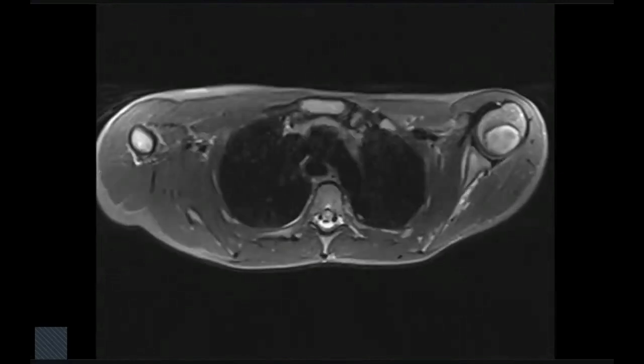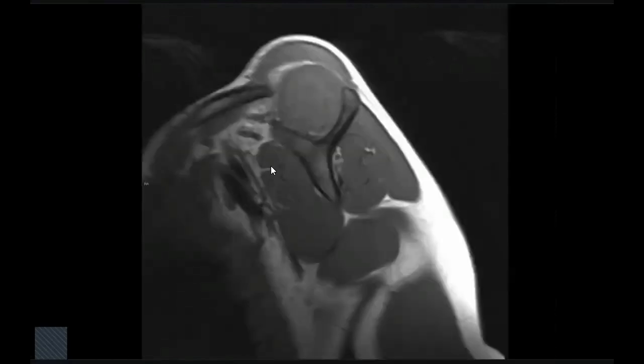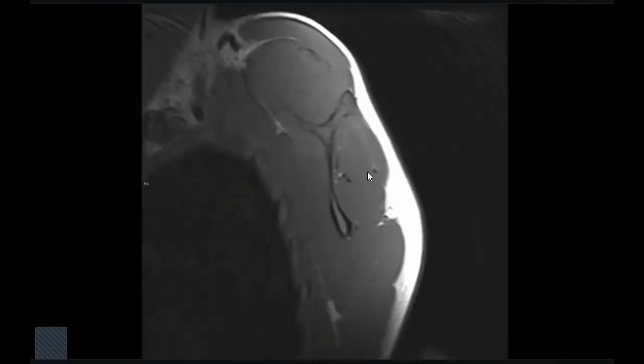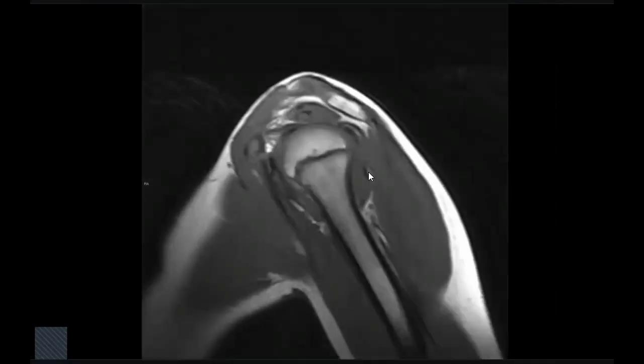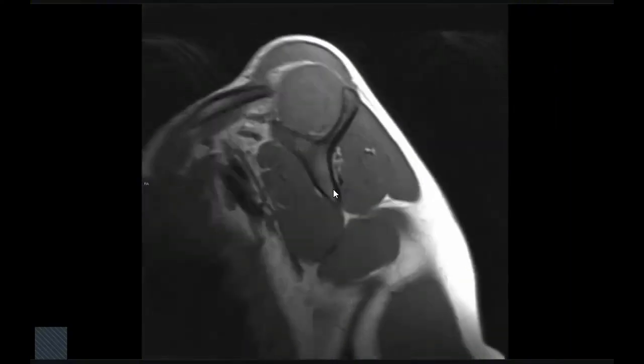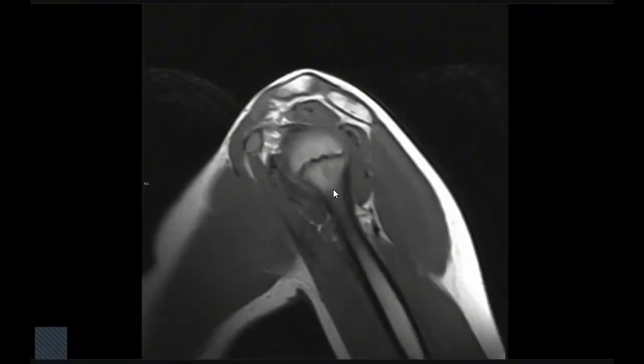Unfortunately, they didn't do contrast for this patient, but there is a large soft tissue component. We have to look also at coronal and sagittal views like this. And then you are suspecting a malignant or aggressive lesion, so I have to refer the patient to the local sarcoma center, do CT chest and abdomen and bone scan for staging, and advise biopsy of this lesion under the guidance of orthopedics to avoid any seeding.